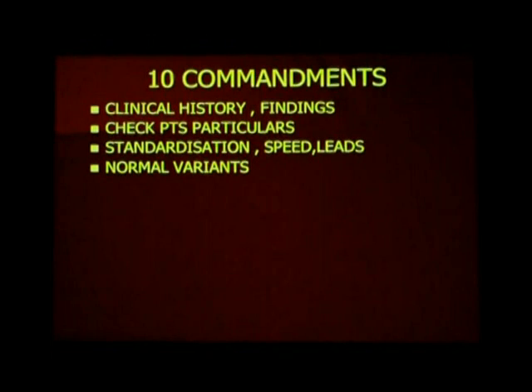Not all ECG abnormalities are disease. You can have so many normal variants. ST elevation is not always acute total occlusion. You can have early repolarization as a normal variant of ST elevation. Not all T wave inversions are ischemia.